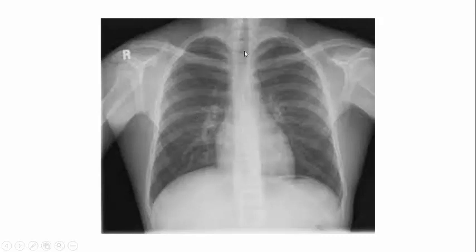And regarding the rotation, that is centering of the patient, you have to see the interspinous line in midline and the medial end of the clavicle on both sides. The distance between the medial end of the clavicle and the interspinous line should be equal on both sides. Otherwise it indicates there is a rotation of the patient while taking the X-ray. Why is it so important? It could cause some abnormal shape or configuration or size of the normal structures, so it could cause some confusion while interpreting.